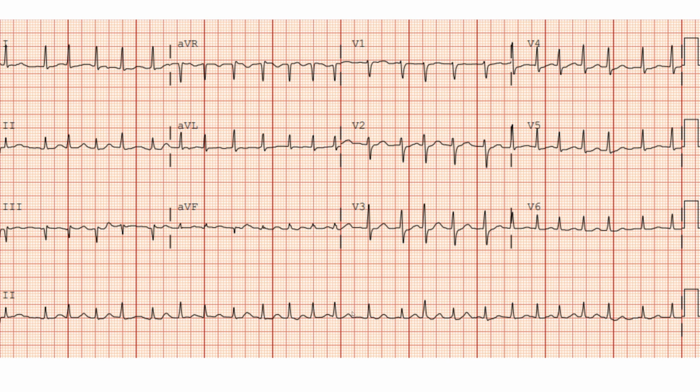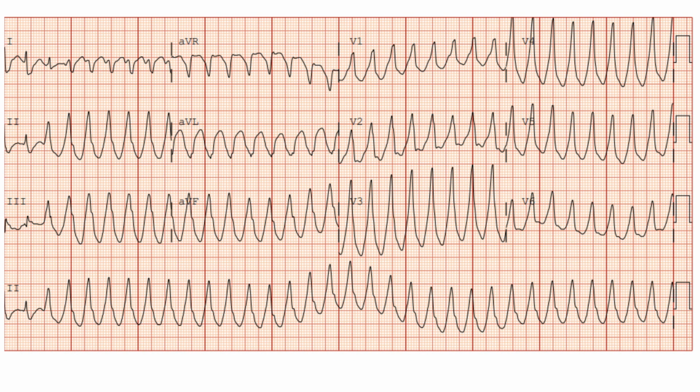What I think is going on is the heart is rocking back and forth as it beats, and it's beating so fast that it might change the beat-to-beat amplitude of the QRS. But again, the main thing is the guy came in with palpitations, right? So this is his first EKG. They start the normal workup, and during his stay, this happens, okay?